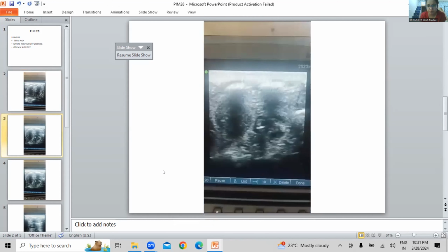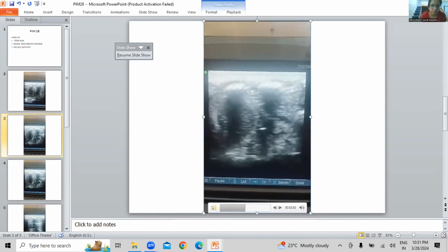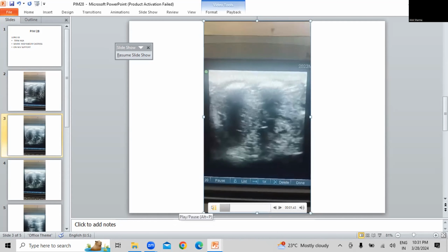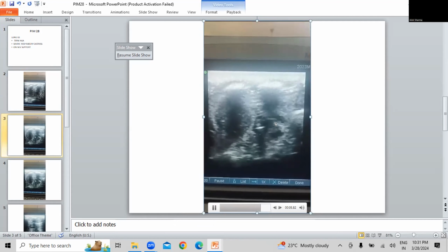Yeah, because of just the uniformity of the appearance. Is this left or right? I'm not very sure. No problems. So in particular, when you look at it, there's just some visible kind of loops there. I would really be worried that's intestine.